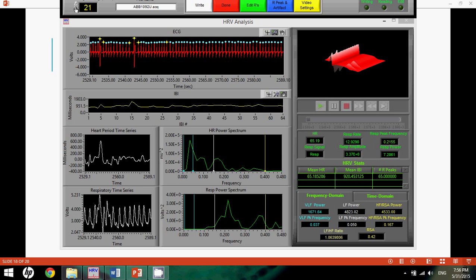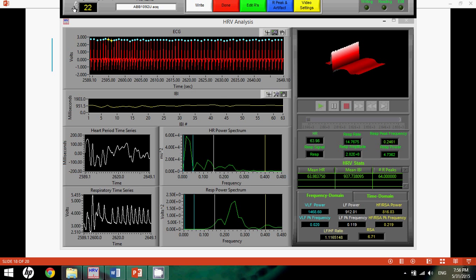Typically, you'll see anything between 5 and 6 for the RSA, depending on what the participant's baseline is. In this case, the jump up to 8.4 is a pretty high RSA, suggesting that these anomalies may necessitate that we get rid of the particular segment. Again, this is beyond our pay grade, so it's necessary that we just mark these as questionable and then allow experts to make those decisions at a later time.